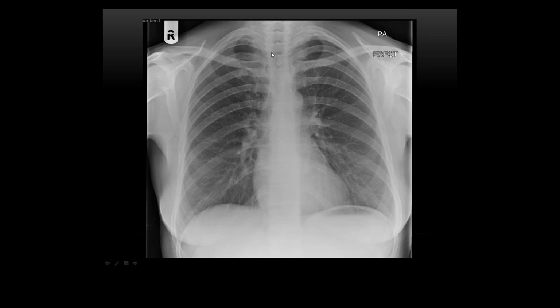Now this is what a normal mediastinum paratracheal space should look like. Quite thin. If you read the textbooks, it says it should be about 3 to 5 millimeters, but within radiology, we don't tend to measure things, you tend to just eyeball it, because it can be affected again by rotation. So a poor quality X-ray can affect all sorts. And this is why sometimes you might have the radiographers ringing you saying, well, there's no way I can get the patient down to the department so they're portable. It's purely because we're trying to get the best image possible to give that more accurate diagnosis.